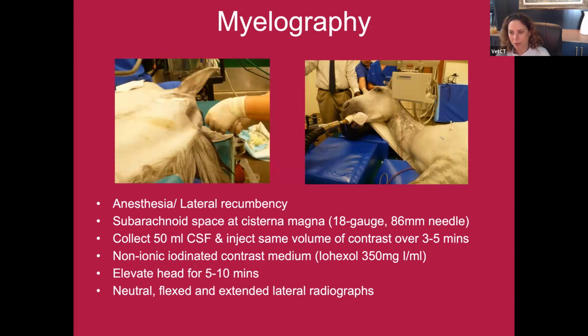So we get lateral radiographs in neutral, flexed, and extended positions, because I really want to put that neck through its range of motion and see if I can identify an area of dynamic compression that may not exist in just one position.